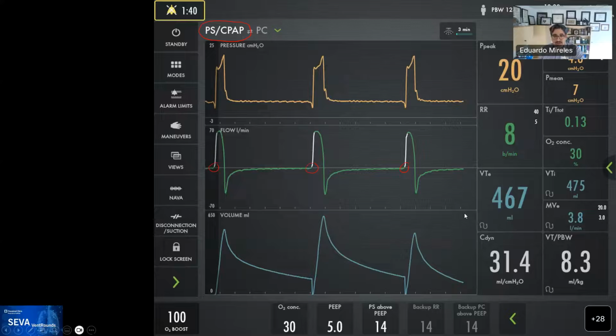So this seems to be related to entrainment and a very active expiratory phase in this patient. Unfortunately, the connection is very poor today, and so we cannot hear Ariel very well. But when we post this on YouTube, we'll be sure to put a comment on what the thoughts were and what the management for the patient was.